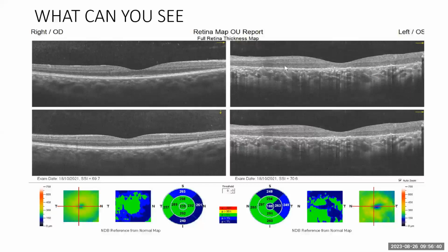Okay, so I'll give you the history of this patient and I'll let you know what the issue is. This is a 30-year-old female presenting with poor night vision of about 3 years duration and a similar history of poor night vision in older siblings. Okay, now you already started thinking, where are the rods? Where are the cones? Where are they represented? A study has shown that this is part of the histological pattern in patients with RP.